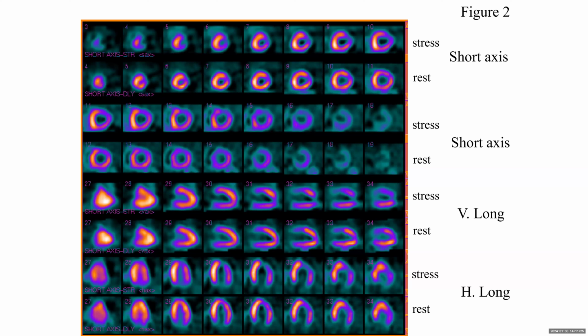It's from the proximal, from the base to the apex. Do you see it really in the base? Yes. So the base is very clear. Look at the cursor. That changed color. There is a mild reduction. There is an improvement at rest, and they see the mild reduction of perfusion uptake.